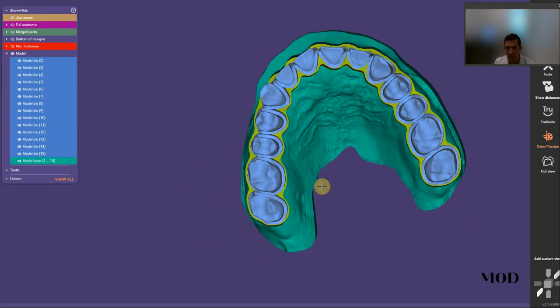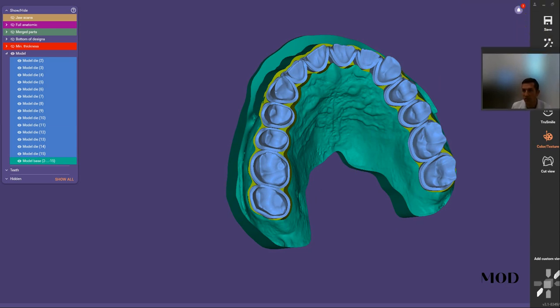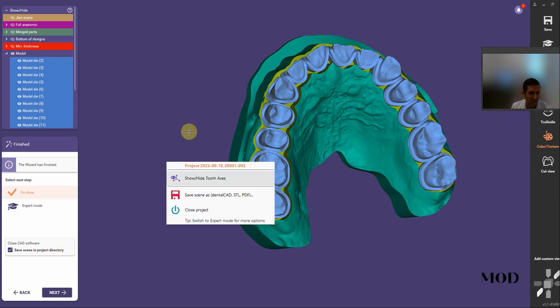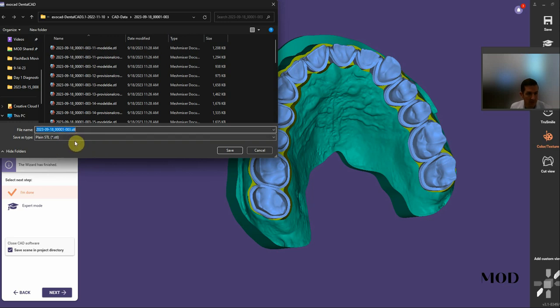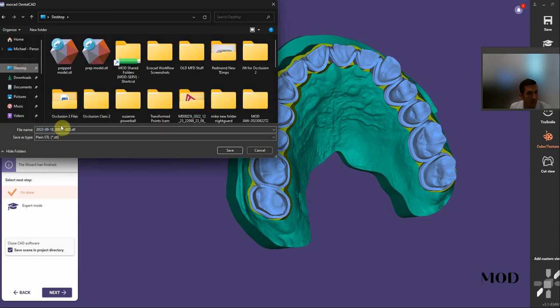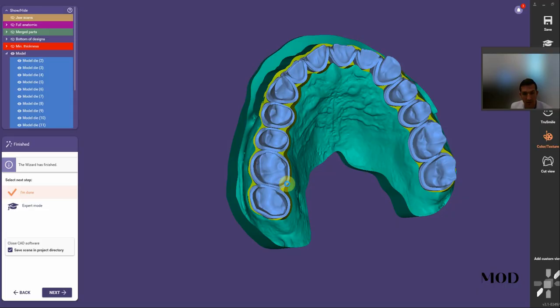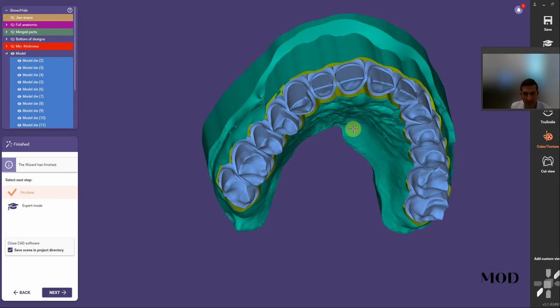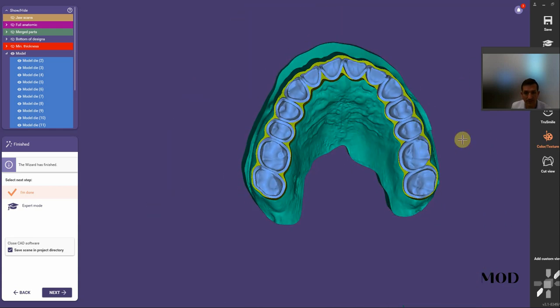And so that would be the model that you would go ahead and use for your wax up. And so then you take this into your case and match it. You would replace the jaw scan for your pre-op condition with this prep model after you get the smile creator set up. And then you would wax to that, and then you would have a much more accurate pre-op wax up for when you're going into preparation.